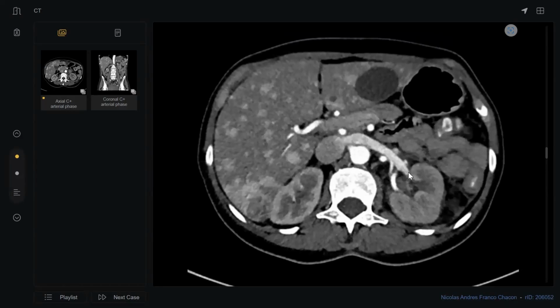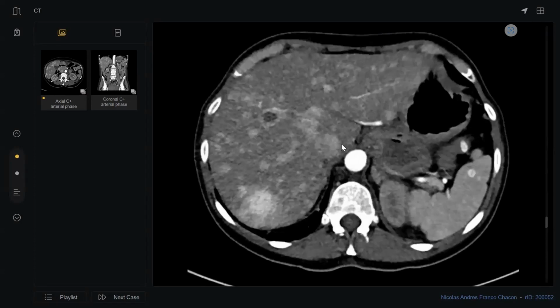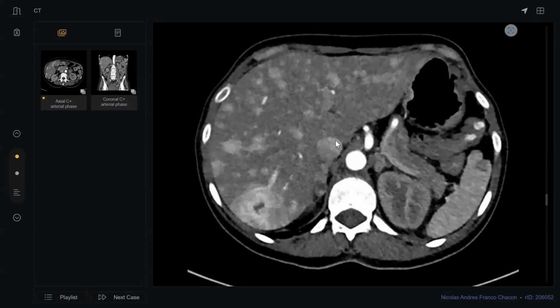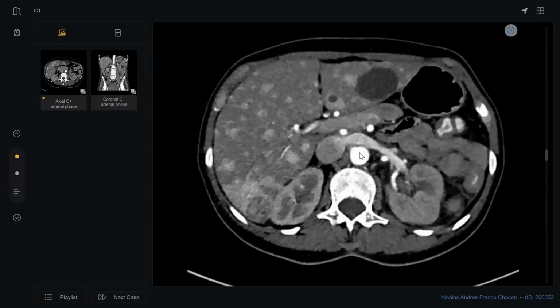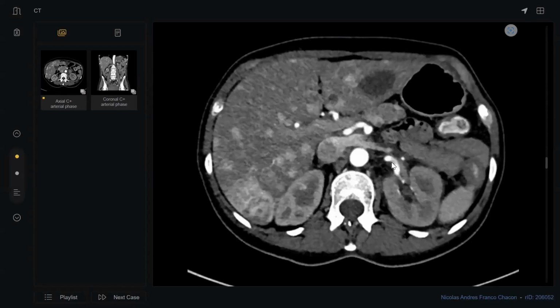Please tell me. So I'm thinking of transitional cell carcinoma, which might be involving the left renal pelvis. Something comes from the left kidney to the IVC. What is the anatomical name of this? By the way, this is not a delayed or late arterial phase. This is normal arterial. This artery, what is the name of this structure? So this is a left renal vein, which is leading into the IVC.